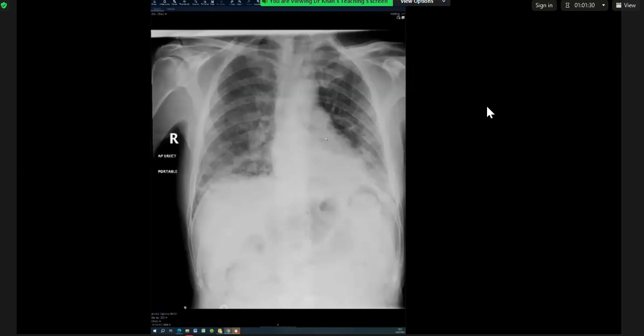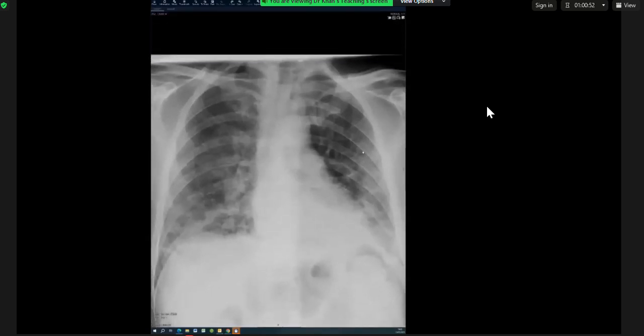Okay, I am presented with a plain X-ray of a 72-year-old male with cough for the last few days. From the first instant, I can detect that there are multiple opacities seen at the level of the right lung lower zone. Again, can you modify the window a bit to see the pleural disease? I feel the image is a bit harsh. Anyway, in my routine practice, I will do this.